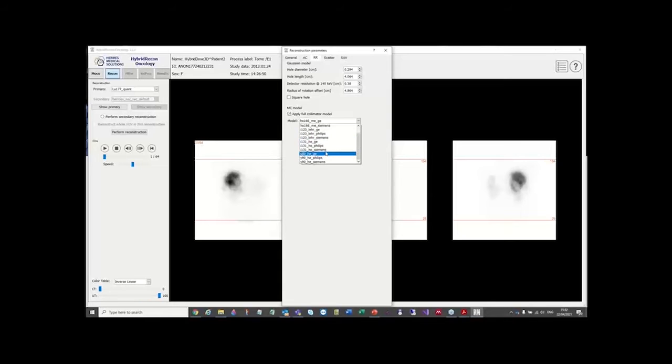And actually, we can do these for your system. I know lots of people prefer, well, some people, lots is probably an overstatement, some people prefer to acquire yttrium-90 with medium energy collimators. So Antti, our developer, has kindly simulated the point spread functions for those systems as well with medium energies. So we're able to add on to here for your own personal system if it's not present yet. And with some good results. You've seen the paper from Oxford there, looking at just the improvement you can get in that yttrium-90 image from the Bremsstrahlung SPECT, something that's reasonably useful for quantitation. It is pretty impressive, really, given how bad Bremsstrahlung looks by itself.